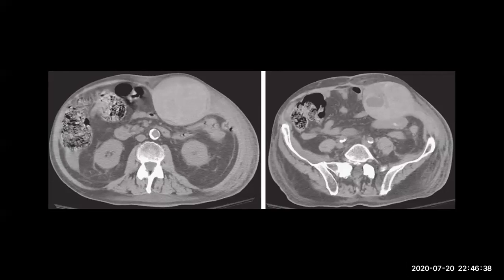And if there is no trauma, maybe rectus sheath hematoma in other, non-traumatic conditions. Okay, very good. The patient is on anticoagulation. So this is a hematoma. There is a fluid level here in this patient. Yes, fluid level. Okay, you have a fluid level in that area. So this is the rectus sheath hematoma in this patient.